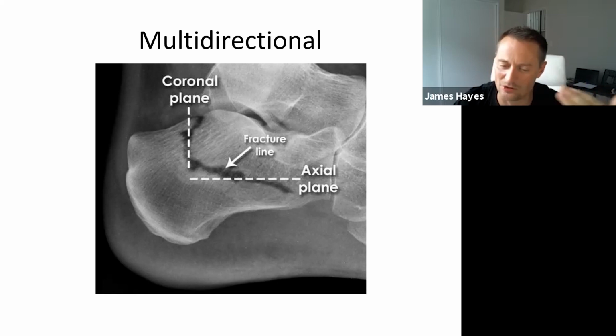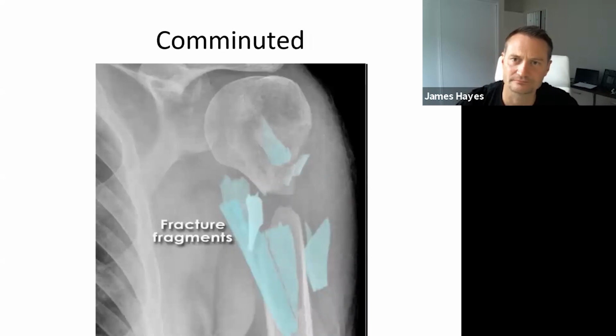So it was thought that a lot of people got this fracture when they were jumping out of a bedroom window when either the actual wife or husband came home. It's also seen in parachutists and skydivers, I think that's the same thing, and hang gliders and stuff like that. Anyone with a hard landing can get this fracture, and it's quite nasty, as you can see.